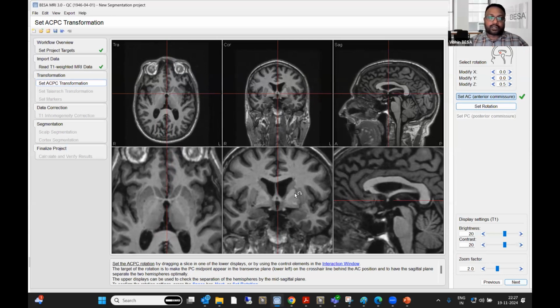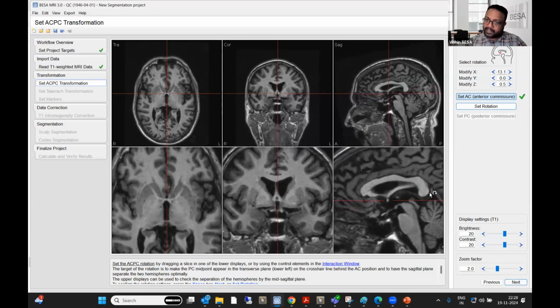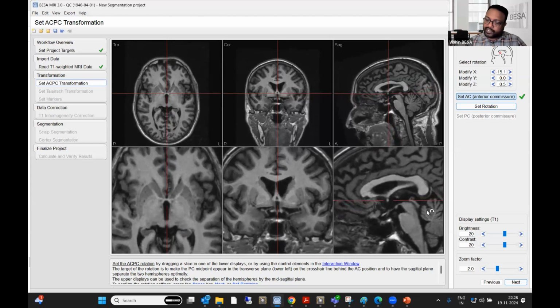So once your rotation is set, on the lower third image, you can see just above this pons, just above this midbrain, a small structure coming up over here. That needs to be in line with the horizontal red marker as I do that. See here? That can be done by clicking and dragging it. When that is done, then we have marked the rotation correctly.